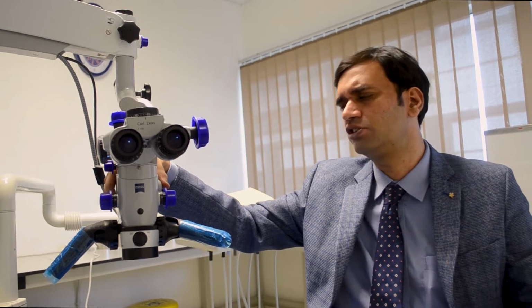we can use it, and most often it is used for procedures like root canal treatment or a crown preparation or maybe a complex surgery, endodontic surgery and so on. So what changes your life in terms of dental treatment? Maybe these two components which come with the microscope. One is magnification, the other is illumination. This illumination and magnification makes it a powerful tool for you to deliver the best dental treatment possible.